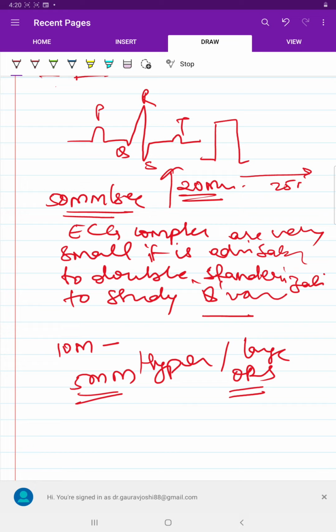So whenever you hold the ECG paper, first thing first, appreciate the squares, small square and large square. Another thing is to look for the standardization. The standardization is 10 mm and 25 mm per second speed. If you are comfortable with this, then we will move forward.